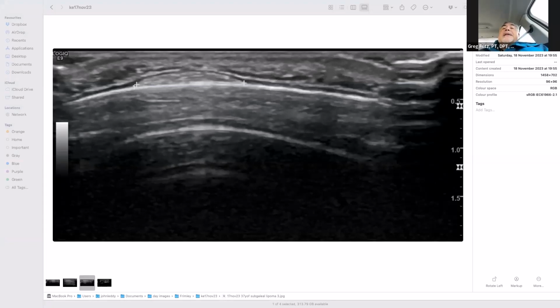Now, is it round? Yes, it's sort of disc shaped, like a very shallow saucer. And it's hemodynamically static. Yes, definitely.